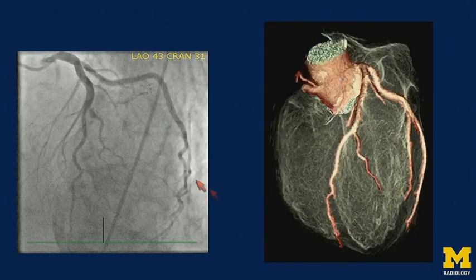Moving on to this view. Now again, we can see that the catheter is to the right. So this is going to be an LAO projection. Now we're rotating in a different way. So what happens is the anterior interventricular groove is now coming to lie in the center of the image, and this is going to be our LAD, and the circumflex moves out. Now, when you're doing CTs, it's always a good idea to look at these volume rendered projections. It's very, very easy to rotate these models around and get comfortable with the different views.